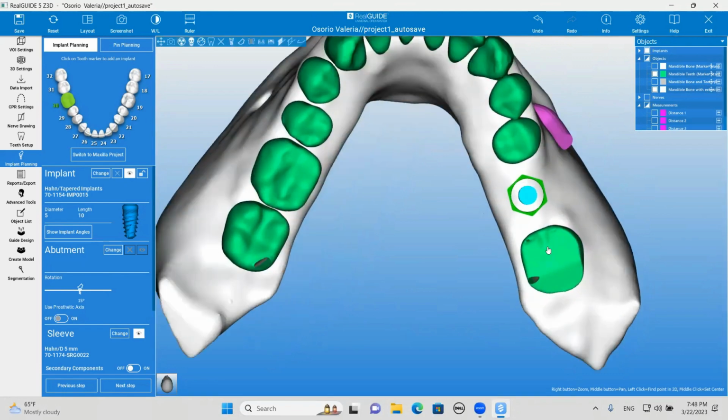Okay, so you can see how it fans out in more of a triangular morphology. So you can actually angle your burr so it's more inferiorly, but going buccally to the implant. Does that make sense? Yes.